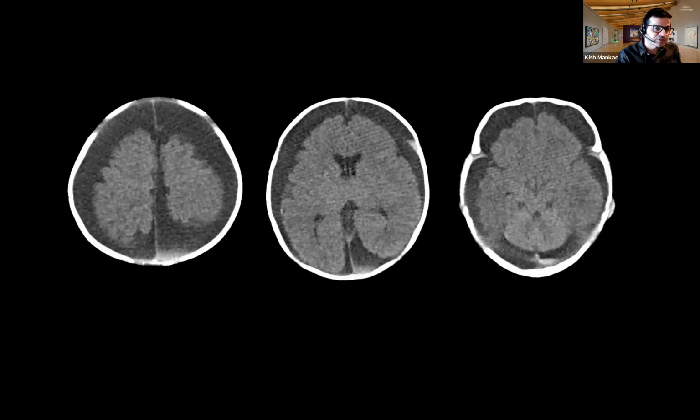Compared to that, when you have a situation like this, and this will be my last case today, I think, before I want to leave you with this thought. It is a silent pandemic going on in the world, but here you can't call it benign enlargement of subarachnoid spaces. You can see that there is collections which are effacing the sulcal folds of the brain sitting on the surface out here, bilateral. The density is a bit intermediate, and there are some hyperdense areas more posteriorly.